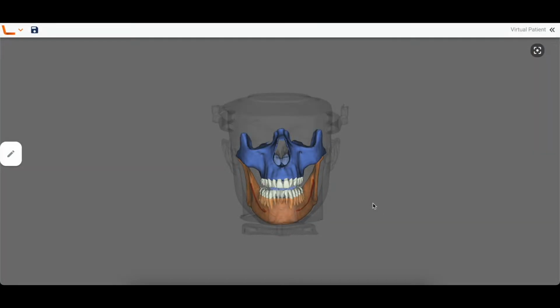In this video, we'll have a look at how we can use a thresholding tool. It's a great tool in order to make a segmentation on the pharynx or the maxillary sinuses, or for example, a clearly depicted part of the bone or teeth on the CBCT scan.